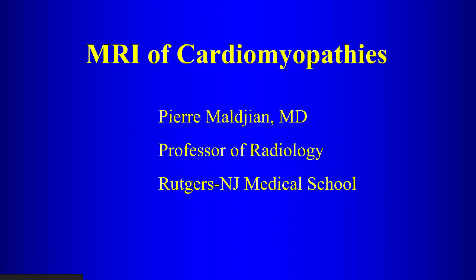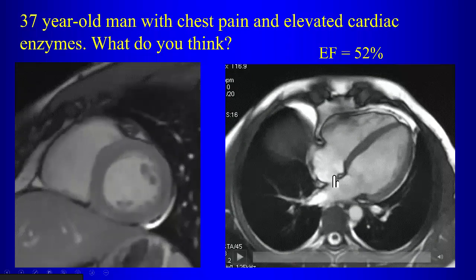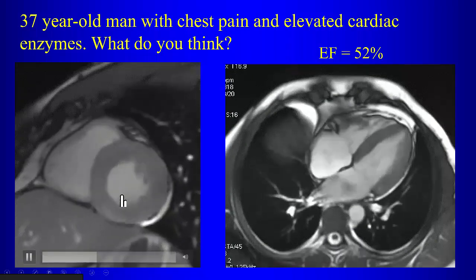Okay, so today we're going to start talking about myocardial diseases. So we'll start with this case. We have a 37-year-old with chest pain and elevated cardiac enzymes. So first of all, what kind of views do we have here?